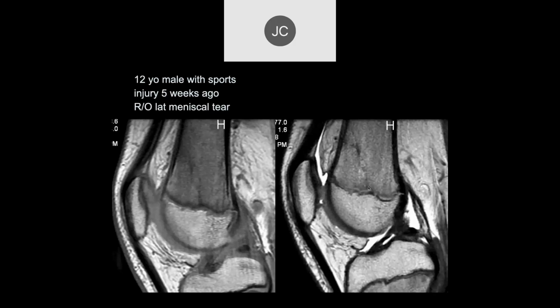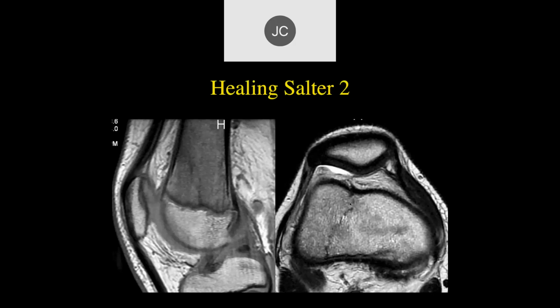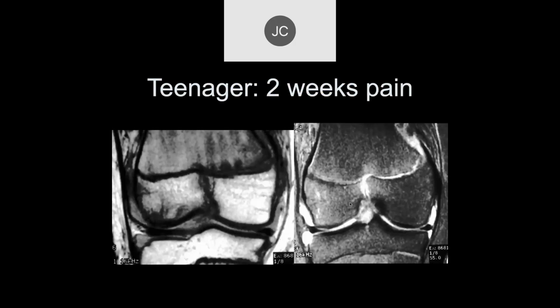Yeah, if we go on the sagittal images, we can see it's 5 weeks, so this thing is pretty much healed. That part of it. And then here on the axial images, you can see the fracture line coming across here. Yeah. Salter 2. Okay.